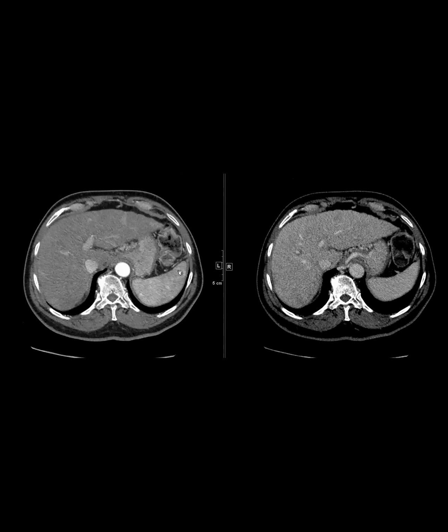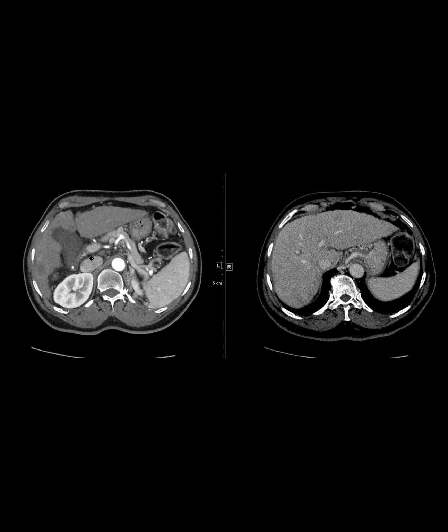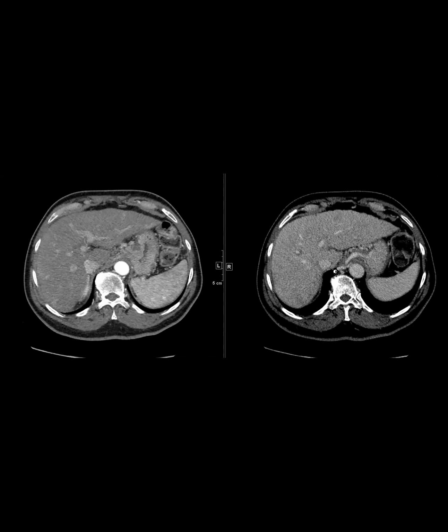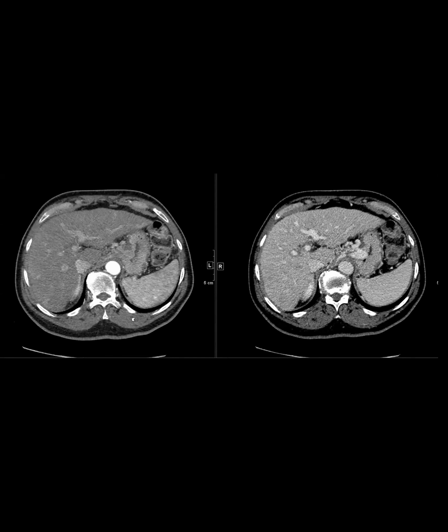According to LI-RADS, these are all HCC, and this is multifocal HCC, stage T4A. Anyway, the patient had a transplant because they met the criteria based on OPTN, and on explant, this was multifocal, poorly differentiated HCC. So it's just a cautionary tale to be careful with OPTN and small HCCs.